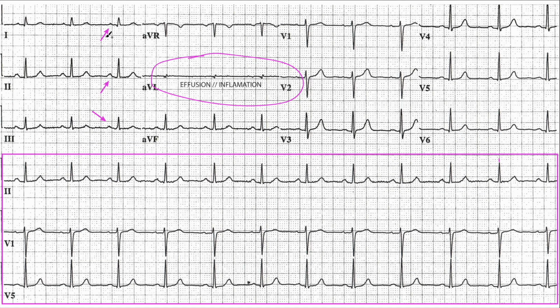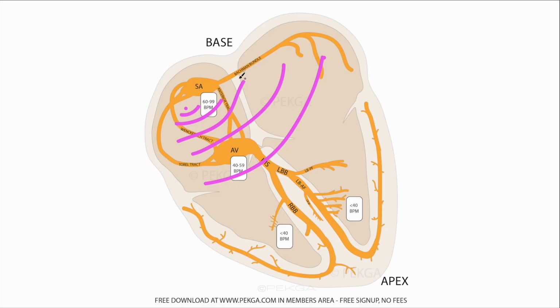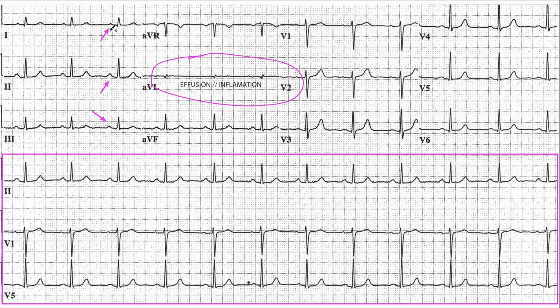Now, looking at this, if I indeed had an ectopic rhythm here, there would be slight changes on the ECG as to how the P wave looks in leads 1, AVR, lead 2, lead 3. There would be slight changes, and those fine details we do cover in our lessons.